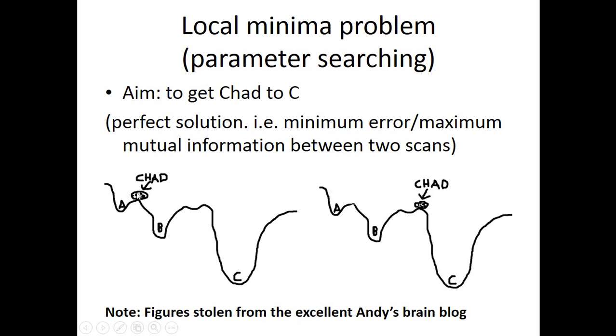Here we have an example where we basically want to minimize the difference between these images. Imagine we start with this position. This isn't necessarily the clearest example, but the algorithm has to get to the global minimum, which is where the images are perfectly or very closely aligned. If we have an algorithm that moves along to the left or right and stops when it feels it has found the best solution, and it starts all the way out here, if it moves to the left, the algorithm is going, oh, it's getting better. The mismatch between my position and where I want to be is better. So this is a bit like moving the images together.